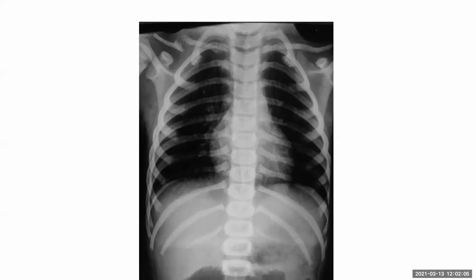So in this 9-year-old child, I would ask the parents regarding any previous history of trauma, and a trivial trauma should not lead to this clavicle fracture. So either this is due to a metabolic deficiency, which has led to this fracture, or if the history does not match, I would be suspicious of non-accidental injury and would order a skeletal survey. Okay, this was the first time the child had this fracture and the trauma history. Anything else you can see?